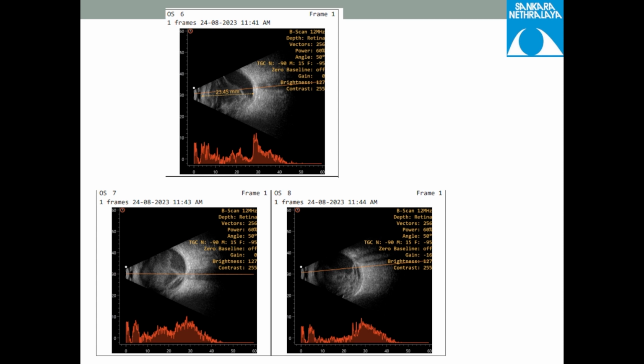Okay, the RD is attached to the center of the optic nerve, but the shadow is not correct. You do have a tissue going across the optic nerve. This means this is an oblique section. You can't comment on that. Secondly, if you want to distinguish RD and PVD, you must look at its after movements, when the eye moves. This image will not tell you whether it is RD or blood-lined PVD. For that, you need to see the mobility of the tissue and where exactly it is attaching on the ONH.